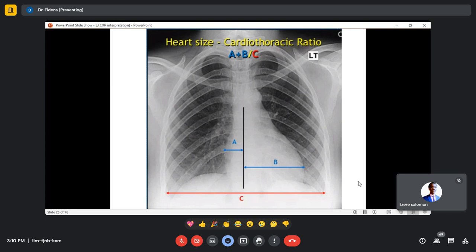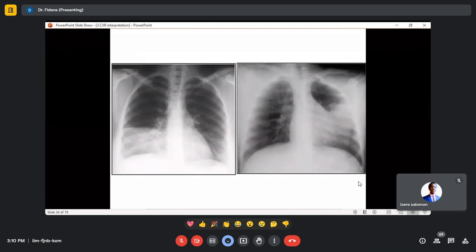Is it clear here? Yes, I hope. Okay. Remember, I told you about the silhouette sign.